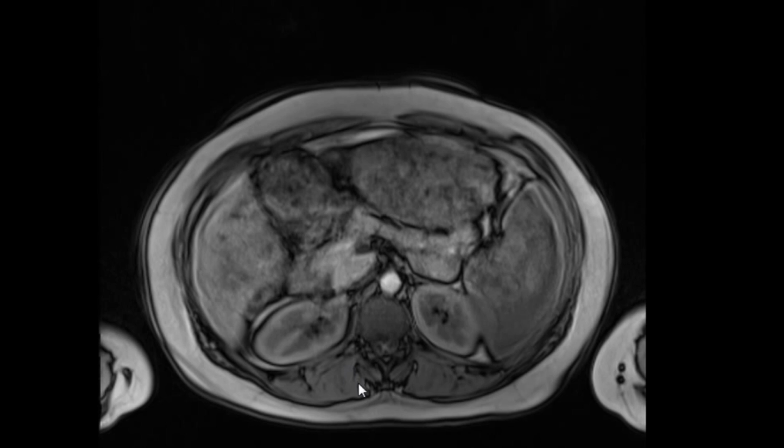They don't change signal, suggesting that these are what? Calcifications. Calcifications in the stomach? Maybe, or foreign bodies, or blood. Calcification, blood, or air bubbles. Air bubbles are way more common to be seen in the stomach than probably any other organ.